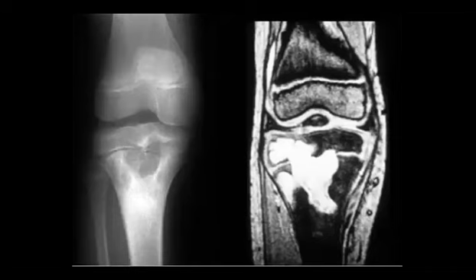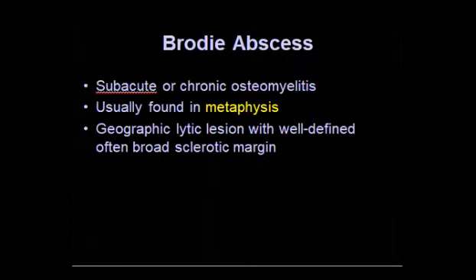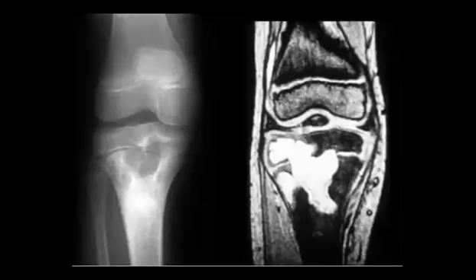Yeah. High signal intensity. So this is what is called Brodie's abscess. Yeah, when it's surrounding the lesion like a penumbra, so it is Brodie's abscess. Okay, thank you.